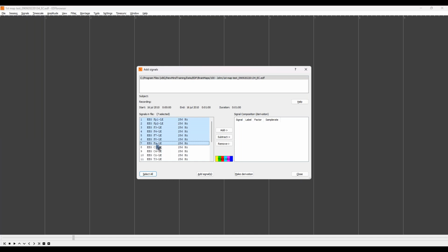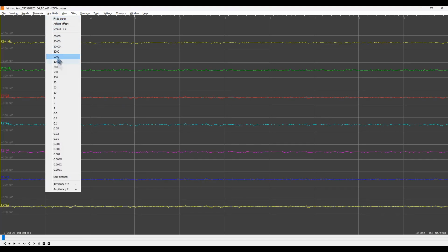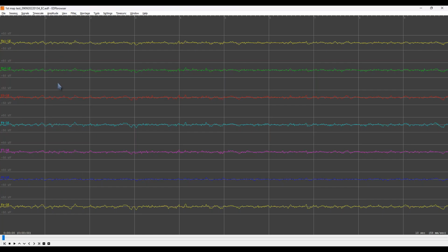Before you leave this screen, you can adjust the montages somewhere on that, right? Yeah, it's up here. That's a nice way to look at frontal versus rear or left versus right. You can adjust it however you want to.